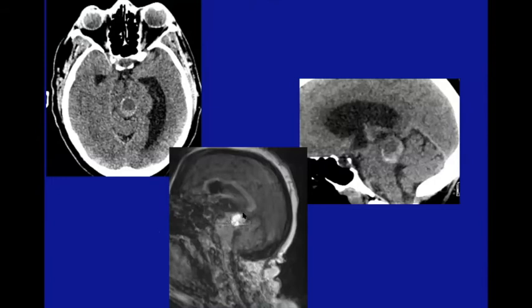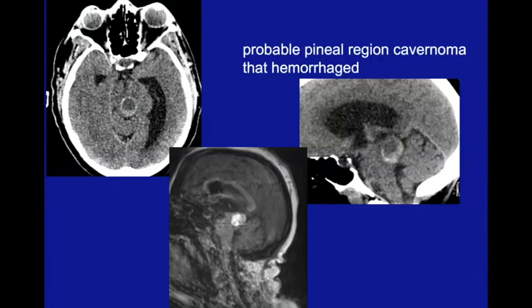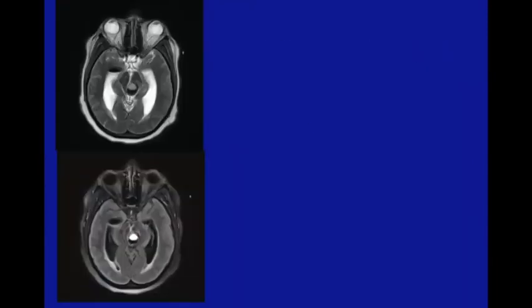This patient had this lesion, short T1 relaxation time in the pineal region with obstruction of the ventricles from compression of the aqueduct. This is what it looked like on the CT scan, kind of this high attenuation rim. In some respects, I thought it resembled a thrombosed aneurysm, but all the vascular imaging was negative. This is what the patient looked like at the presentation with the hydrocephalus, fluid level in this space. This is what they look like 2 months later.